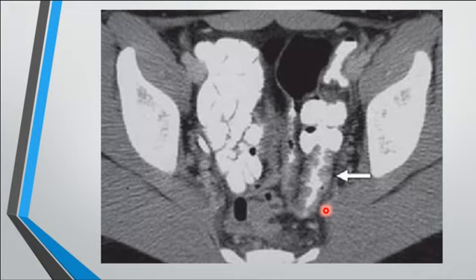Diverticulitis. Well, it is one of the differentials, but I'll give you some information. This patient is young, a teenager. It is a sort of infection. And I'll give you another hint. It's a viral infection. Herpes. What do you want to ask if it's herpes? You have to ask something before you say it's herpes. By the way, it is herpes.